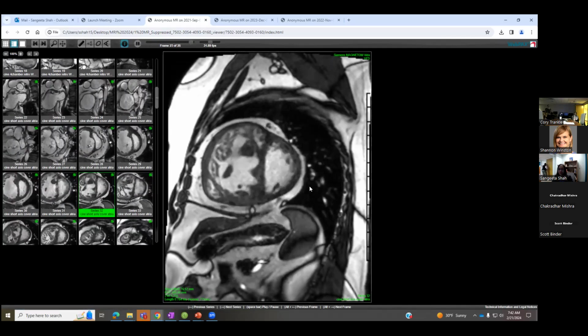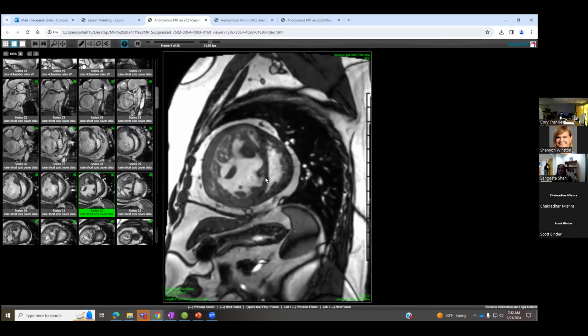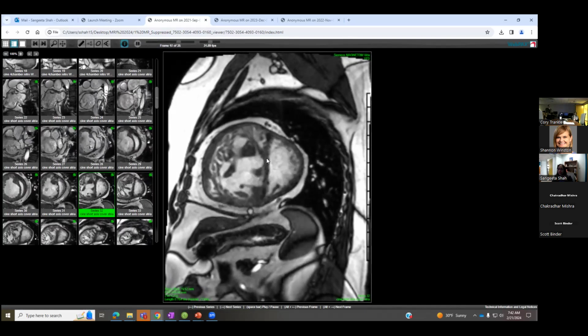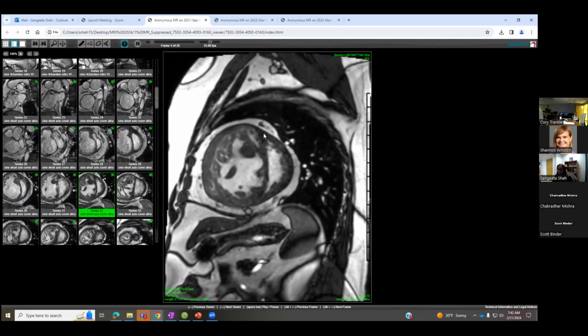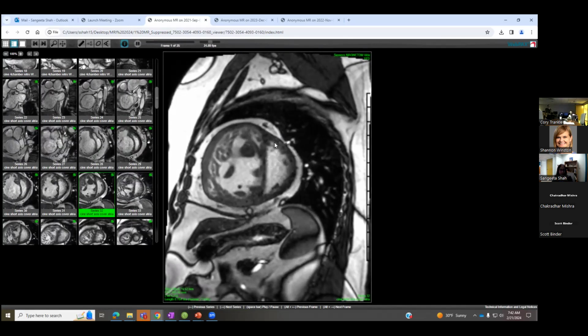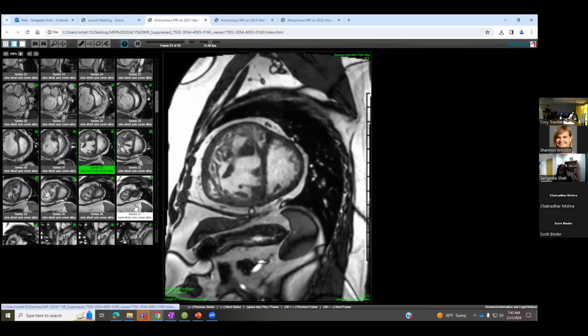This is short axis, and what MRI allows us to do is do quantitative function of the RV and LV by tracing all this. When we have a D-shaped septum, this is the one time that we appreciate a D-shaped septum, and it's a positive in cardiology, is because this means that the RV pressures exceed the LV pressures. If this septum becomes straight or shifted towards the RV, that means you're developing pulmonary hypertension. It's 32.